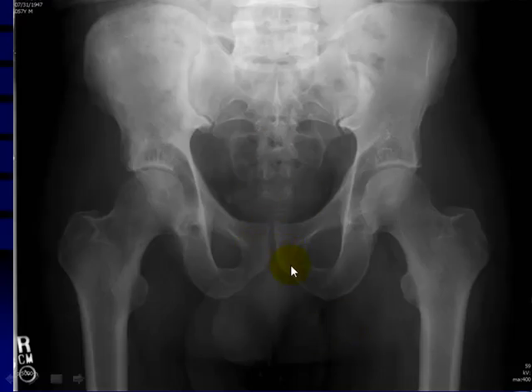In this patient, it's very subtle. People see that? You see which side is abnormally thickened? Right here. Yes, very good. So right here, thicker than the left side. This patient has very subtle early signs of Paget disease here in the right hemipelvis.